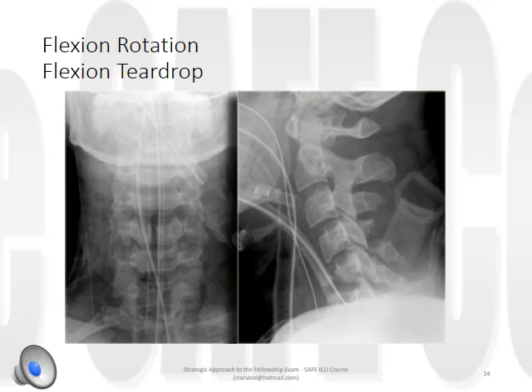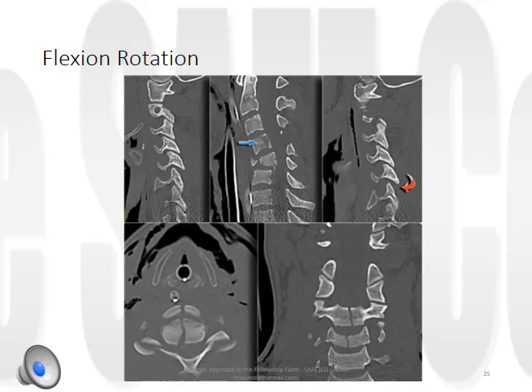We're going to look at an MRI of this type of injury later, and you'll see just how much pathology is evident. If we consider the CT images of the same injury, the vertical orientation of the fractures of the bodies of C4 and C5 indicate that there was severe axial loading. You can see those cracks straight down the middle on the axial and coronal sections. These vertebral bodies have exploded with a propulsion of bone fragments anteriorly. Those are the teardrops, and the larger part posteriorly against the spinal cord.